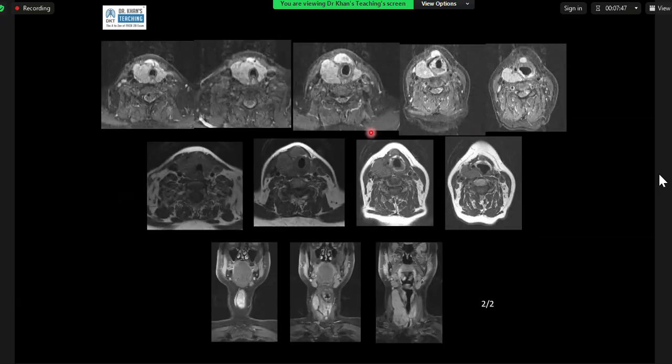So on MR, this is the MR. In this case, the thyroid is normally seen also, and there is a bit of hypertrophy, and this is that tissue, just like the case which I showed you, it is going superior. The key point is that on all sequences, the signal intensity is equal to the parenchyma. And then you know your embryology, and then you can be very confident.